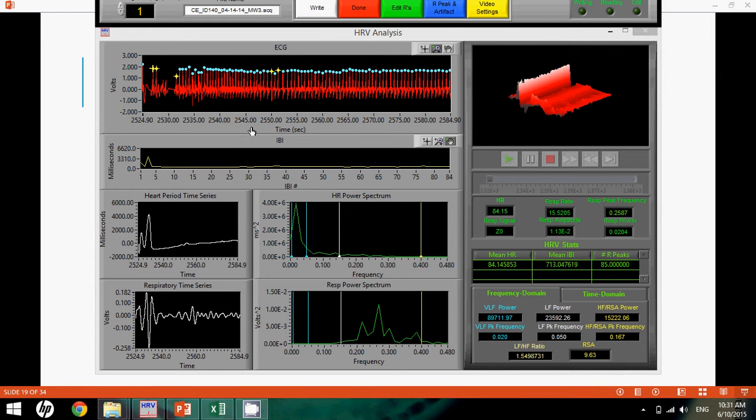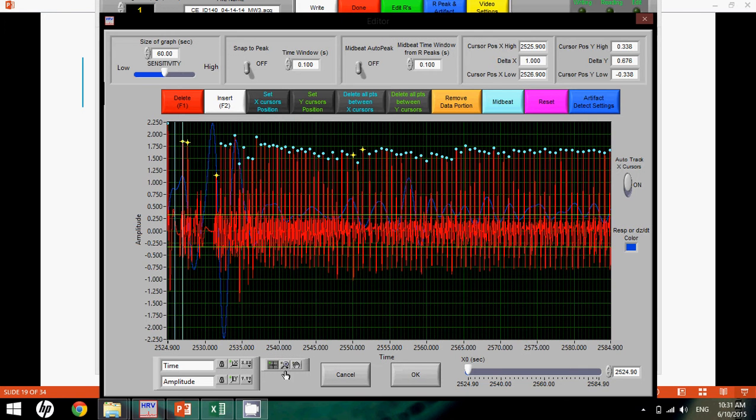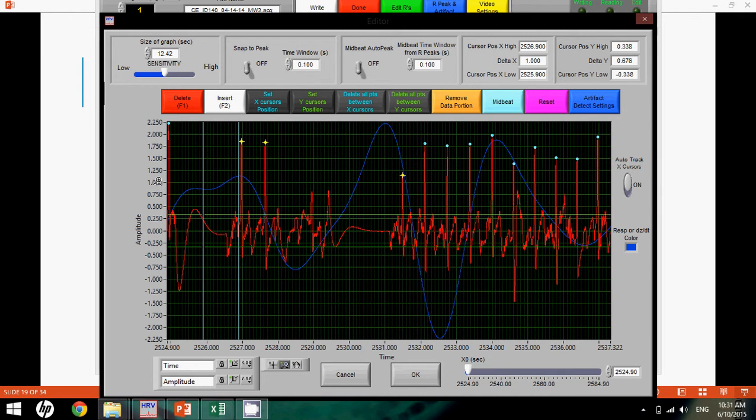Okay, in this portion of the data, we notice that we do have some issues here. The first issue here is obviously this one, and the second is we have some ectopic beats again. We'll ignore the ectopic beats for now and focus here on this portion of the data. The biggest thing to keep in mind is that in this particular instance, you can eradicate any portion of the data before the initial R spike. And once the initial R spike is valid, everything after is also valid.